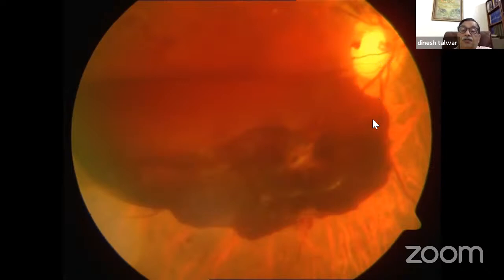You see this? You can see the vessel there. Yes, sir. This can confuse you into thinking it is subretinal because the vessel is seen. But if you follow it carefully, you will see it's cut off. If you follow the rest of it, you know that it is above, because it's cutting off in many of those areas.